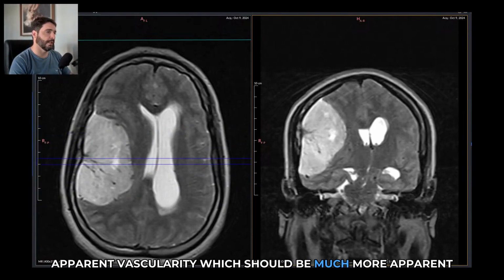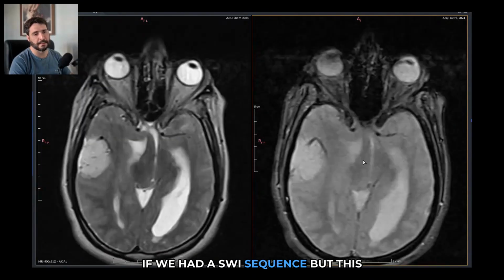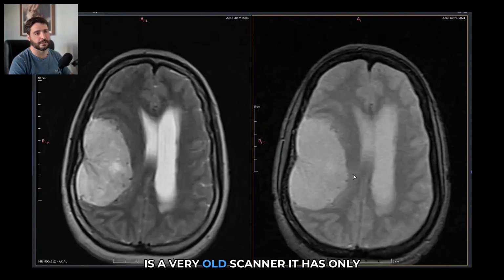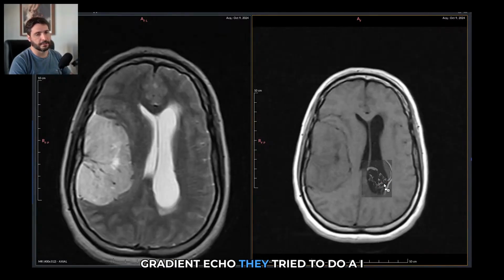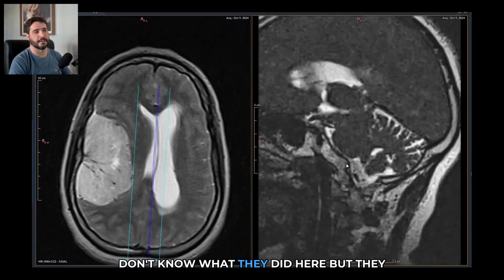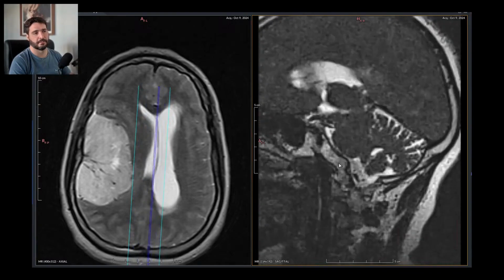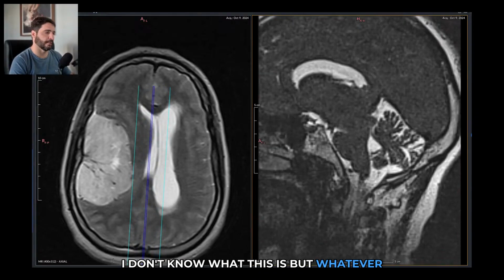Which should be much more apparent if we had a SWI sequence, but this is a very old scanner. It has only gradient echo. They tried to do a, I don't know what they did here, but they did. I don't know what this is, but whatever.